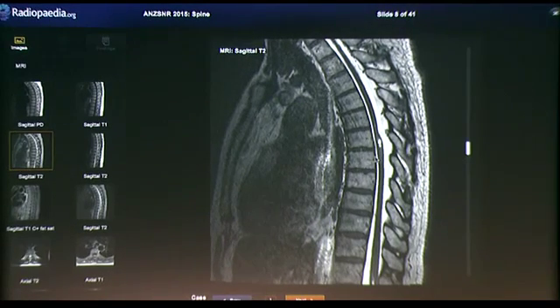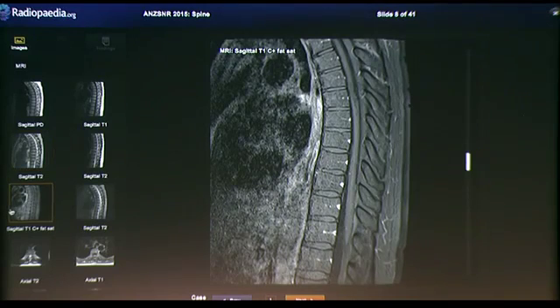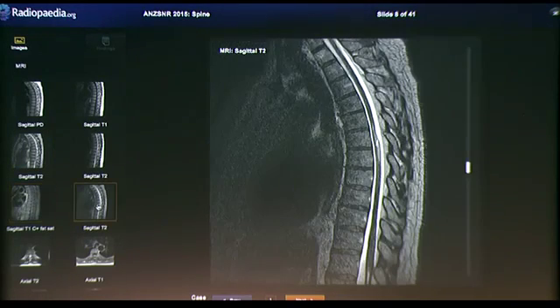Now, at first glance, you've got a cystic lesion in the cord. You might think, look, is that a mass? Is this a tumour? So there's a couple of things which would point you away from that. So one, there's no enhancing lesion related to that. The other is that really, although this bit you could argue that is actually a bit expanded, this bit here is thinned. And I have to say I've not really seen a mass tumour that causes focal thinning, particularly in the absence of evidence of previous treatment.